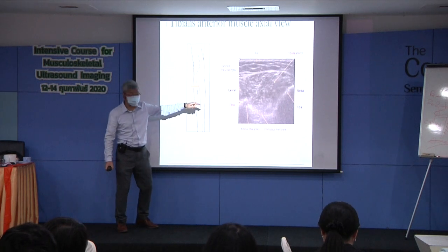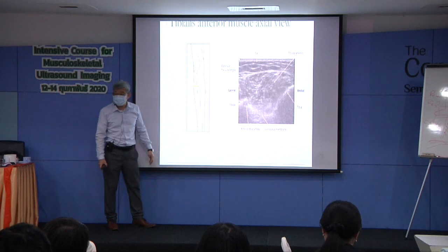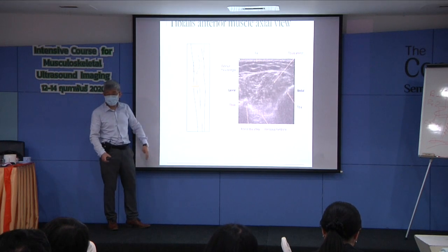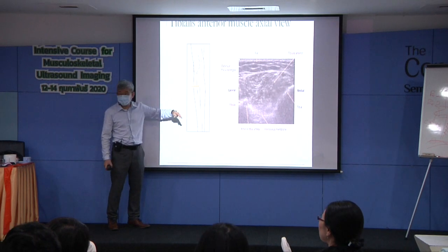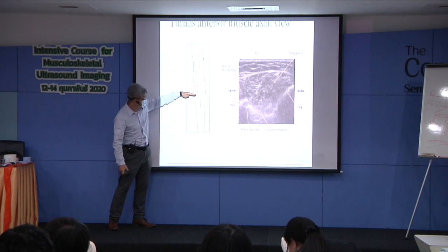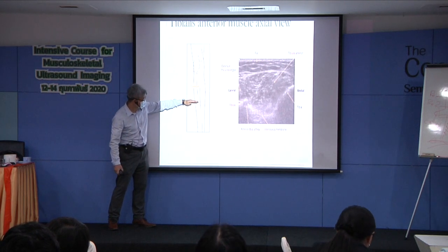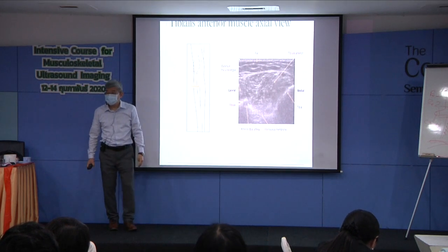If someone shows you a picture like this, and you ask which level the imaging was taken at: 1, 2, 3. 1, 2, 3. 2.